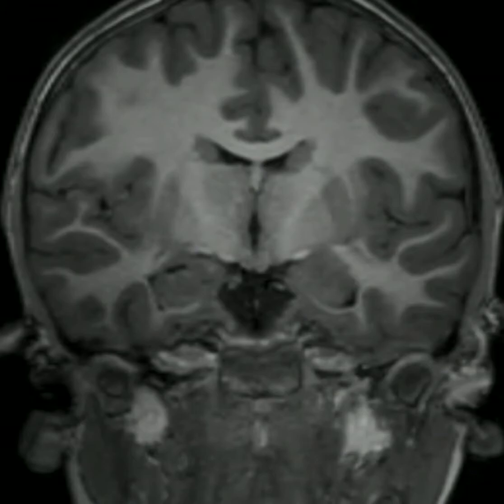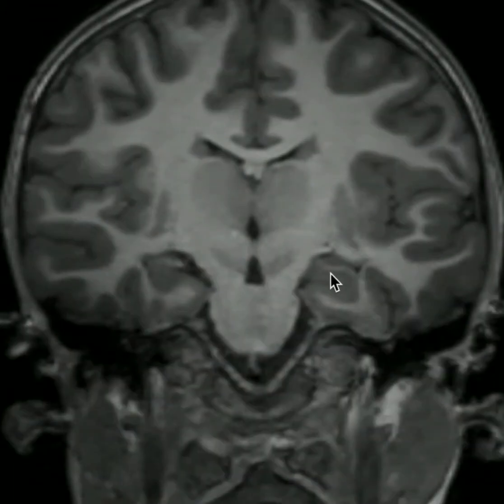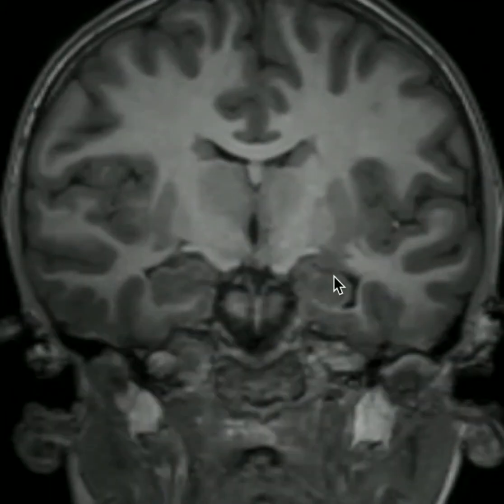Going back a few slices, we're going to look at our hippocampal heads again, which we often look at closely in cases of suspected mesial temporal sclerosis. These may become atrophied as well and may lose their normal architecture. We discussed the complex architecture over here of the dentate gyrus, the horn of Ammon, the alveus fibers here, and more posteriorly the fimbria. So this fine architecture may be very distorted in cases of mesial temporal sclerosis.